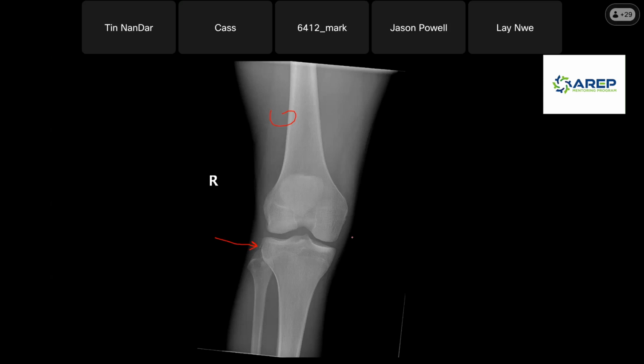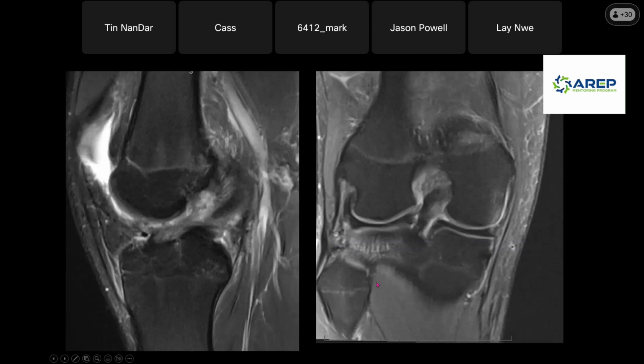No, yeah. So basically, what happens is the lateral collateral complex. We used to say lateral collateral ligament, but we've kind of gotten away from that. Now we'll say the lateral collateral complex. The lateral collateral ligament proper is the fibular collateral ligament, but there are some other structures that are involved in that.